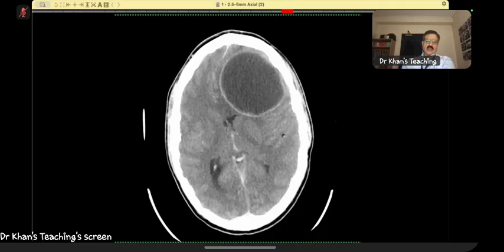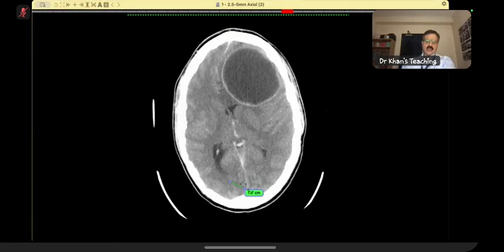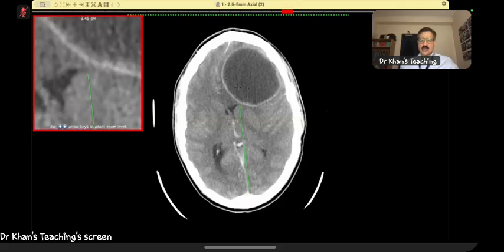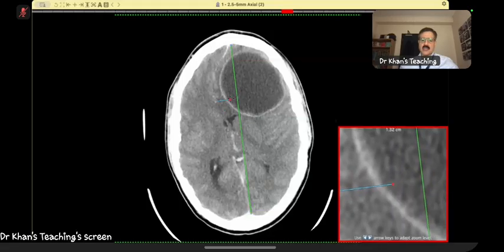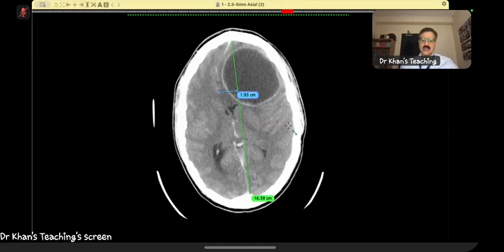Now, if you go to fine touch, usually I don't do it, but in this case, if an examiner asks you, you should know: the midline shift, how much is it? Anything more than 2 centimeter is taken as extremely alarming. Usually you don't have to, but in another context, this can be asked. Less than 1 centimeter is fine.